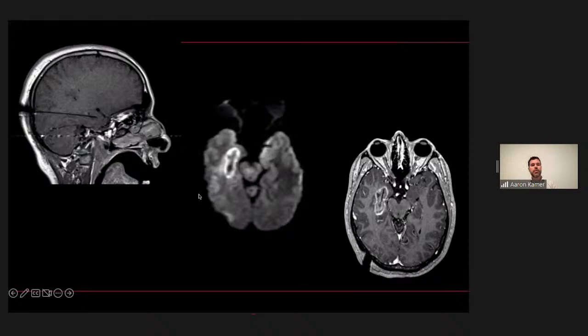So the next way that our patients can be treated, the next least invasive way, is by ablating the region of the brain that has been causing seizures. Obviously, one of the most common parts of the brain to lead to seizures is the hippocampus, and you can see that there is an ablation probe that's stuck from the occipital region, coursing into the temporal lobe with its tip at the anterior aspect of the hippocampus.